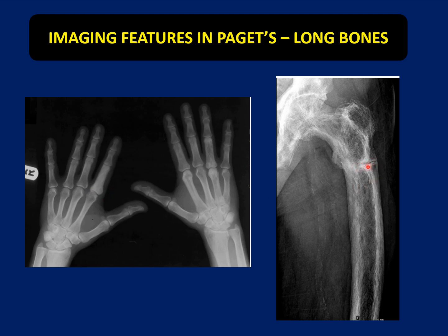Here we are able to see insufficiency fractures or banana fractures, which are more horizontal in nature, and which typically occur in the convex part of the long bone, where more tensile strength is experienced by the bone. So this is another feature. This we will be describing when discussing complications of Paget's disease of bone.